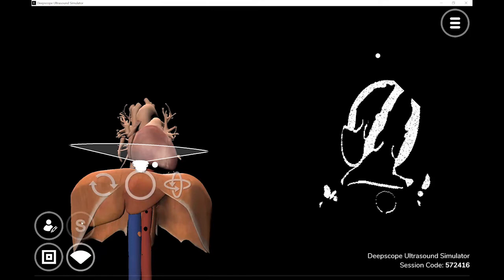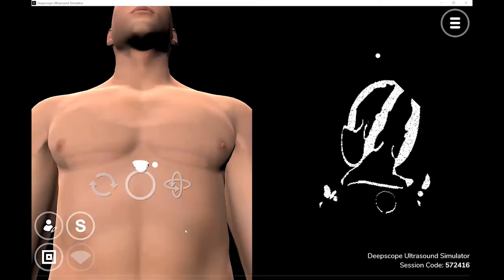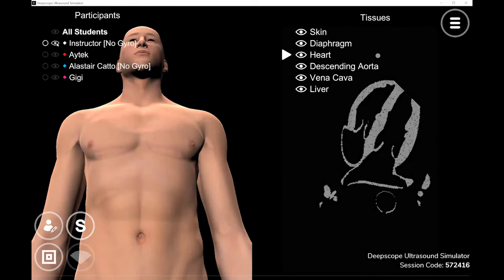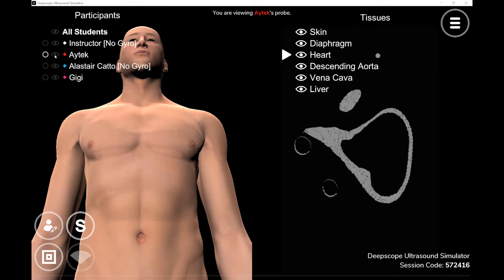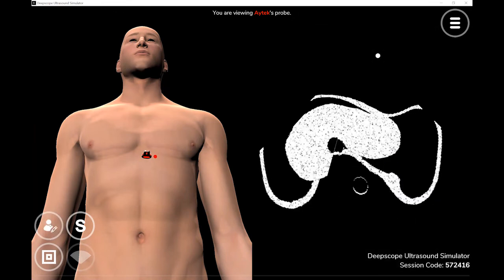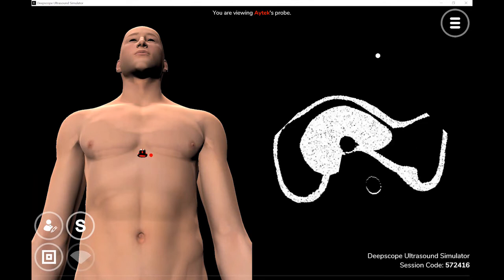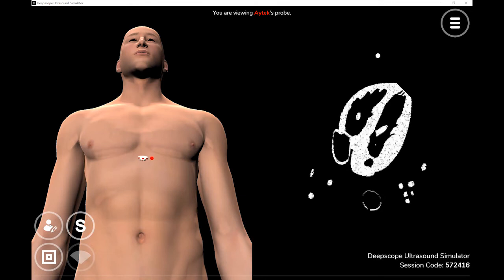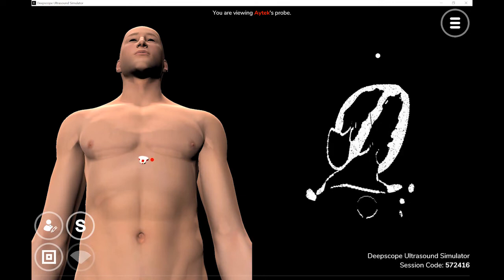Now let's invite some learners to play. Let's say I'm going to take mine off. Now I'm going to allow Aytek to join in only. Aytek, why don't you go ahead and see if you can get the same view? Yep, sure. Beautiful. I think I'm getting closer. Fantastic. Outstanding.